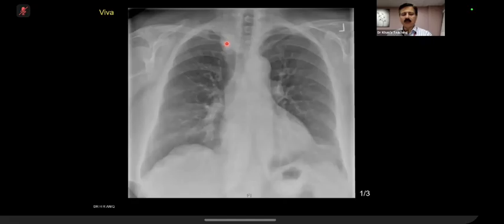On the other hand, if a mass is posteriorly placed, there will be lung anterior to that, and it is a sort of extension of what we call the silhouette sign. Because of which the margin of the mass will be crisp and sharp. This is known as the cervicothoracic sign, and this indirectly means that there is a posterior mediastinal mass. Classical exam film. So they will show you this. They will ask you the cervicothoracic sign. They will ask for the explanation.